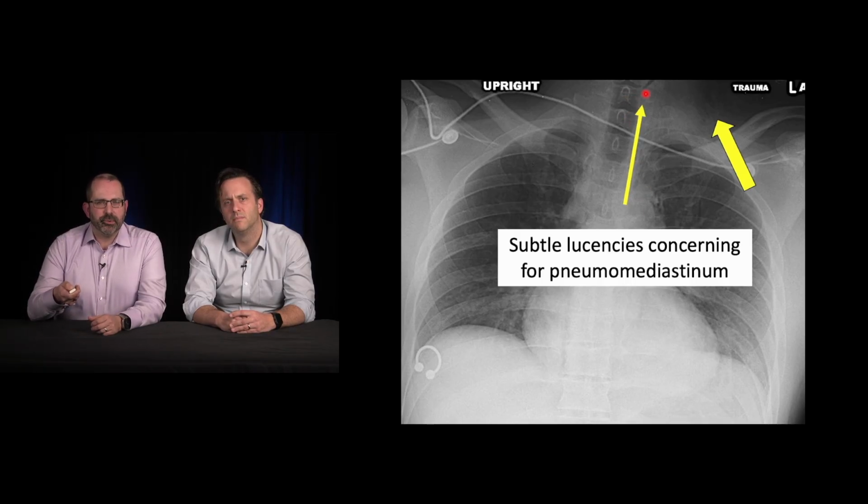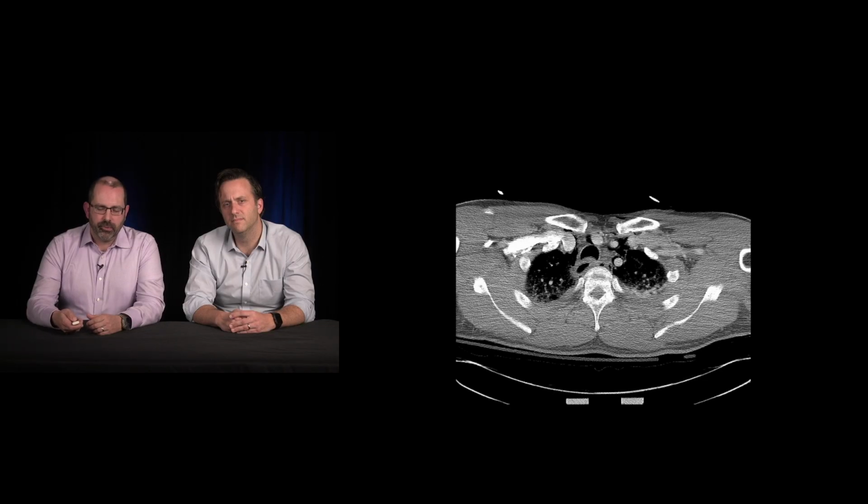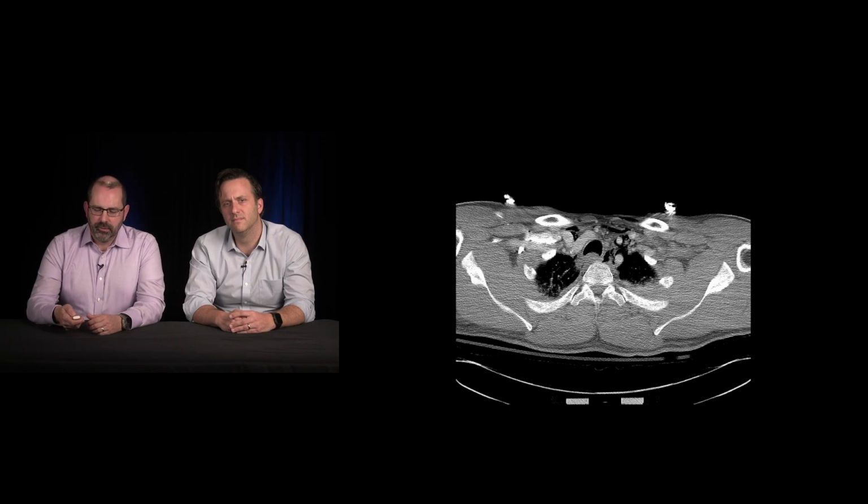That's pretty concerning for pneumomediastinum. And so now we have a gentleman with pneumomediastinum after vomiting. All right, so alarm bells are starting to go off. Absolutely. We're going to scan this guy. And as we do, already you can see lots of pneumomediastinum up in the neck, all these air densities.